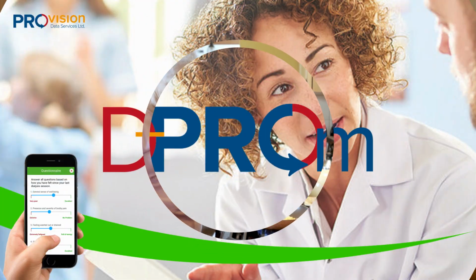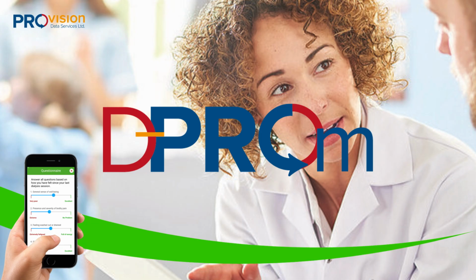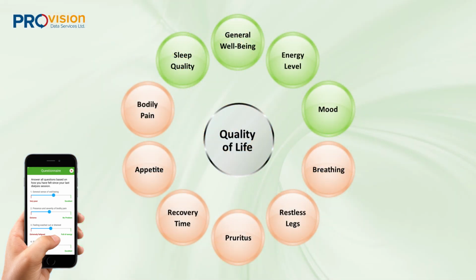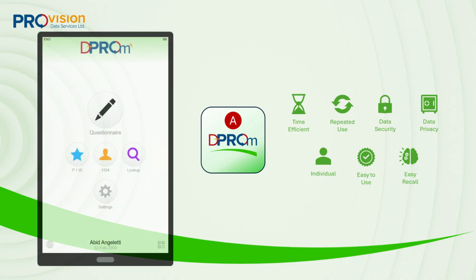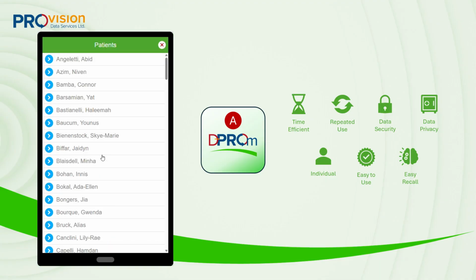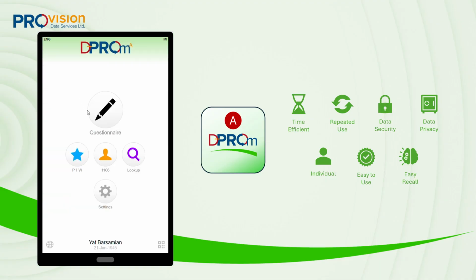The D-PROm Assisted application is designed to empower patient lives and enhance their health by seamlessly integrating patient-reported insights into their unique care plan. This short guide walks an administrator and a clinician through installing and configuring the D-PROm Assisted app on an Android or iOS-based smart device.